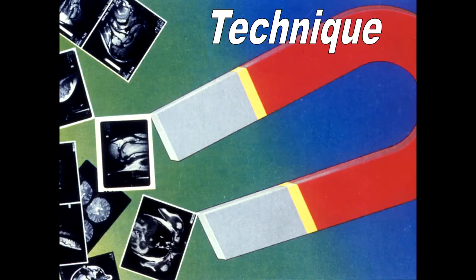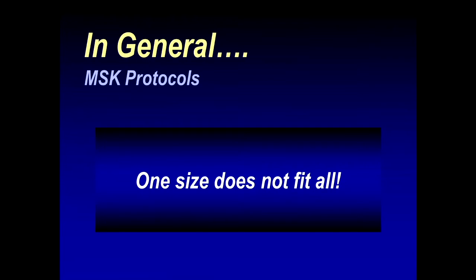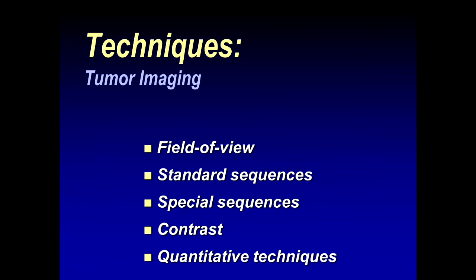Now, as far as the technique, I think it's important to emphasize that one size does not fit all. You need to tailor the exam to the mass based on your evaluation of the radiographs and the history. And it is very important, and by doing that, you can get optimum results. And there are a lot of features or factors that you can adjust as you go through to base this on. One of the most important is field of view.